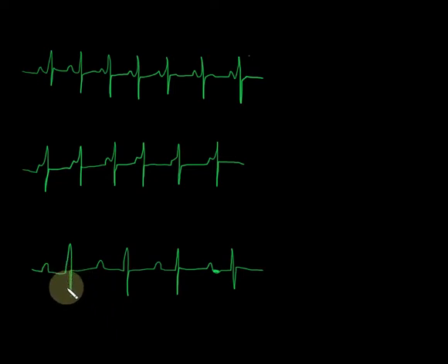So that one looks maybe a little borderline wide. That one's not so bad. And then I got a couple narrow. But the shapes and the design on these QRSs are essentially consistent throughout. So I've got narrow QRSs. I do have P waves, and the P waves are upright. So the P waves being upright here are nice and clean. The PR ratio, well, P wave QRS, P wave QRS, P wave QRS, P wave QRS. So it's still a 1-to-1 PR ratio. But now look at the PR interval.